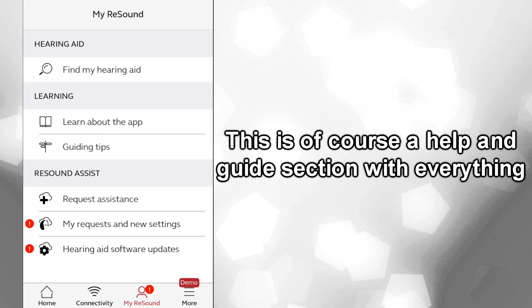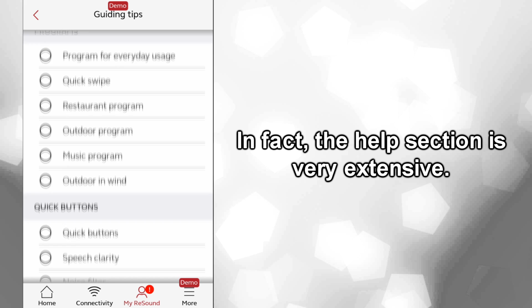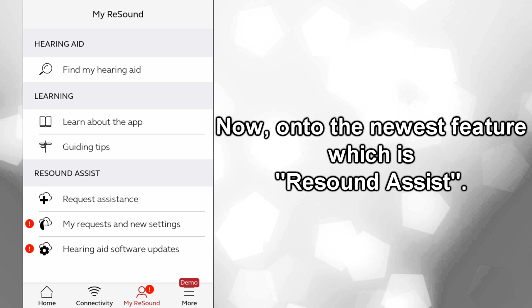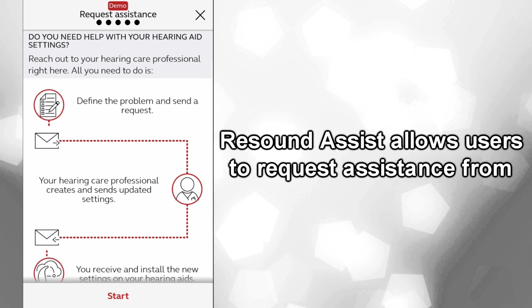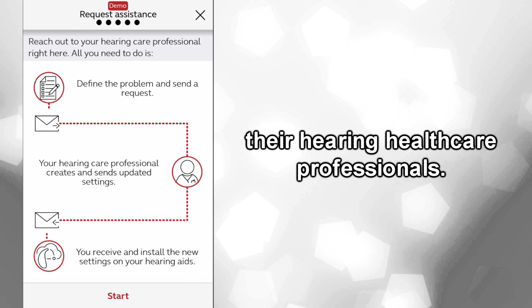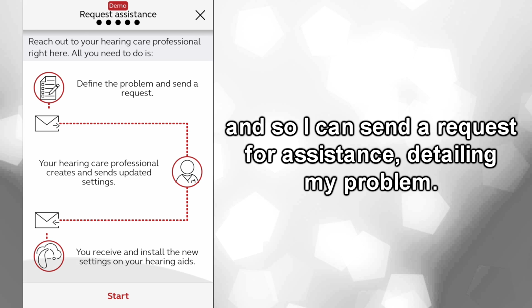This is of course a help and guide section with everything you would need to know about the app. In fact, the help section is very extensive. Now onto the newest feature, which is Resound Assist. Resound Assist allows users to request assistance from their hearing healthcare professionals. For example, I might not get enough clarity with speech and background noise, and so I could send a request for assistance detailing my problem.